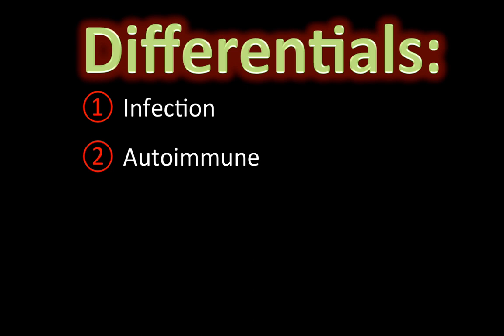Another good point to keep an eye on is that autoimmune encephalitis classically involves the most medial aspect of the temporal lobe. So if you have lateral extension of the findings within the temporal lobe, such as what we saw here on the left side, this would make autoimmune encephalitis a less likely possibility.